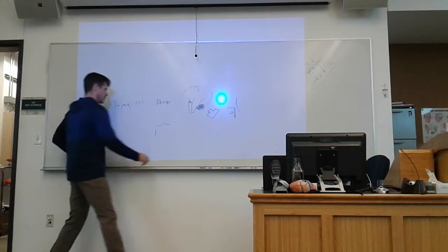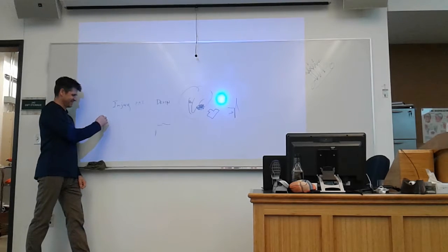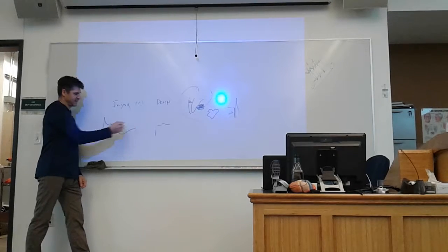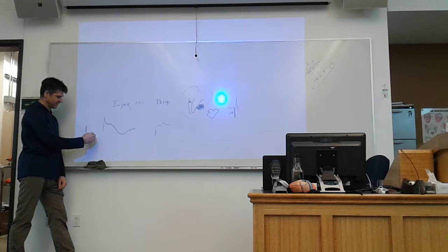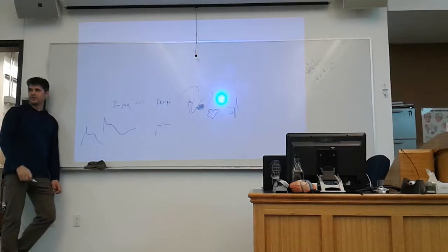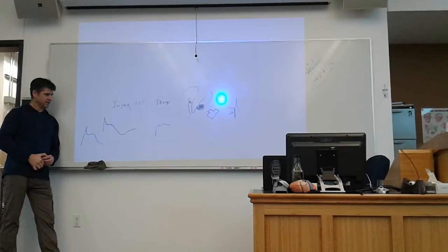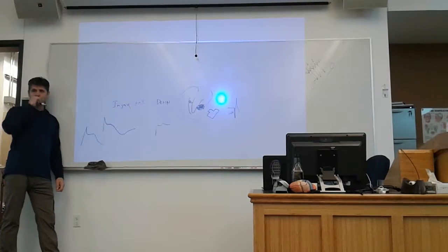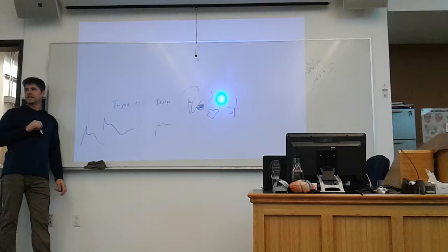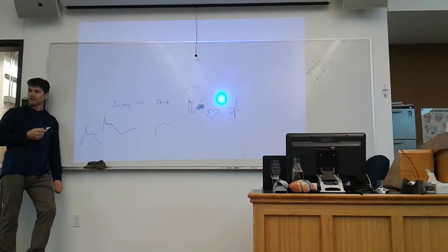It depends. Sometimes you will see something like this, where the T wave comes down. Sometimes you will see something like that, where the T wave is up high. It just depends on which lead you're looking at. Is seeing the inverted T wave worse because it's both injury and ischemia? No, because that completely depends on the lead you're looking in, because some T waves are supposed to be inverted in certain leads.